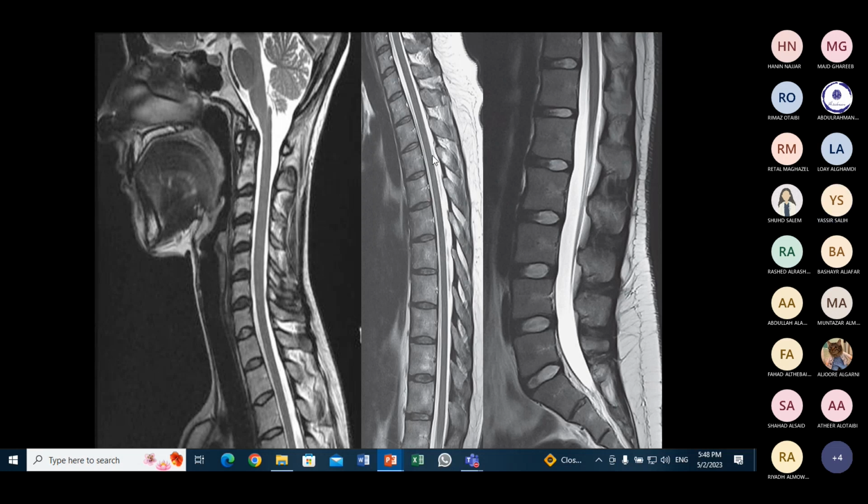What about this? Yes, this. Okay. Please try to comment. The same for cervical also? No. This is a thoracic vertebra. طيب, also this is a lumbar. For the lumbar, please look, what is this? What are these?